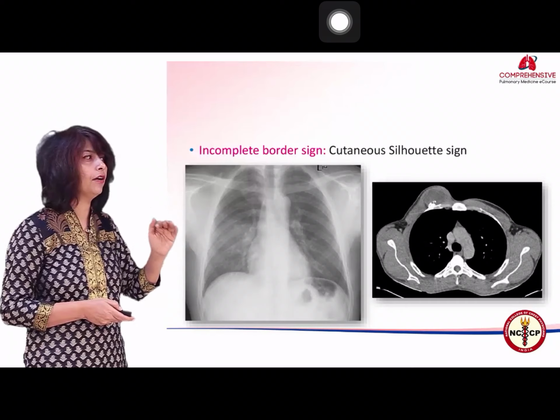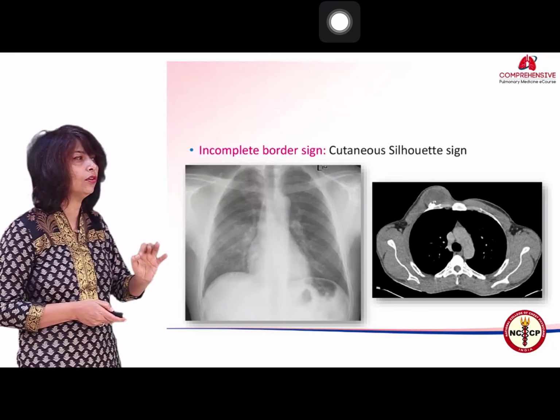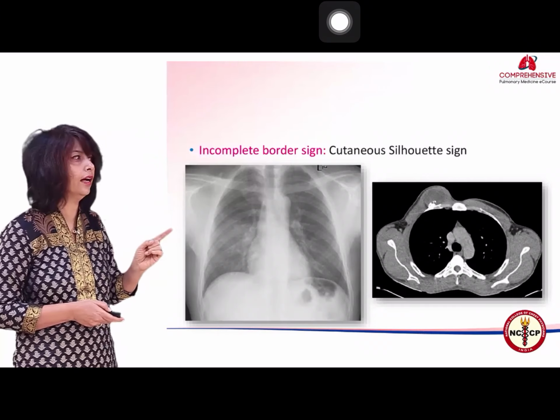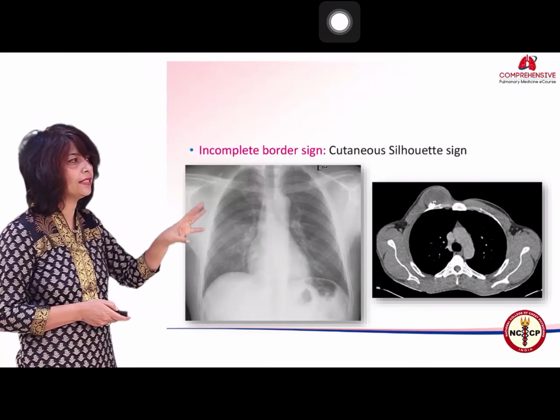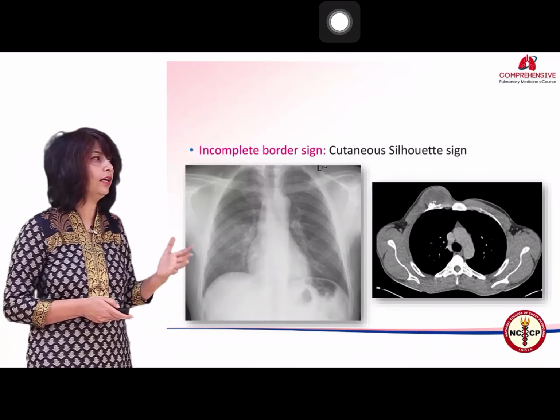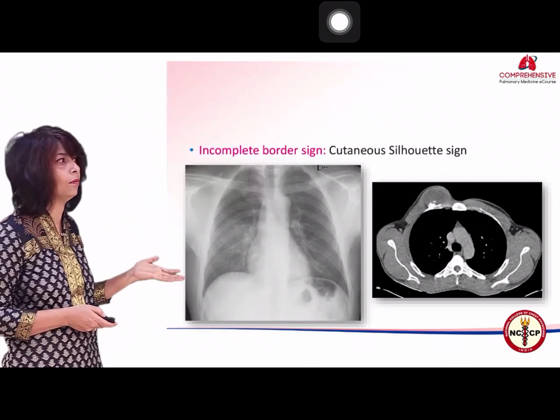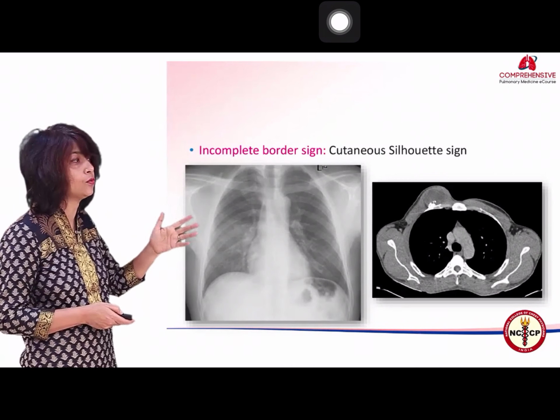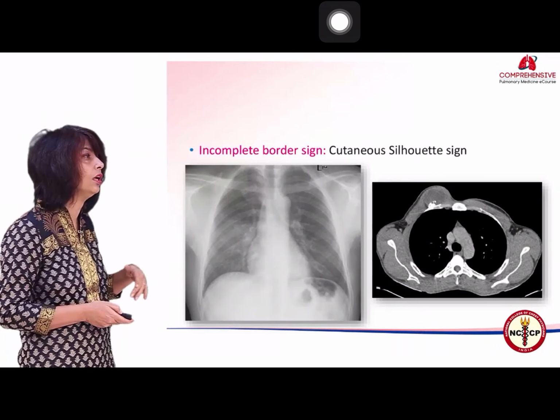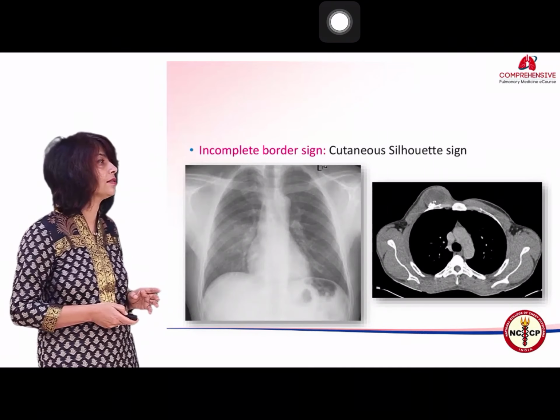Unlike the lung lesion, when one border completely fades out, you know that you may be dealing with an opacity outside the lung, because a lot of people can mistake this chest radiograph lesion for a parenchymal lesion, while actually it's a chest wall lesion, because I can't see the inferior border. Laterally it's touching the chest wall and I cannot see the inferior border also.